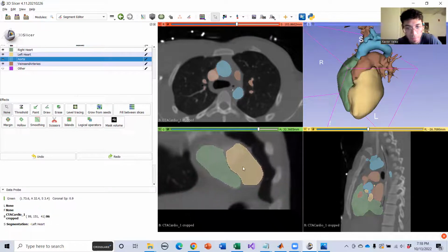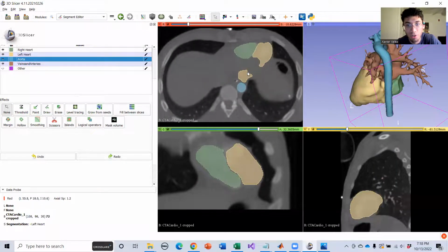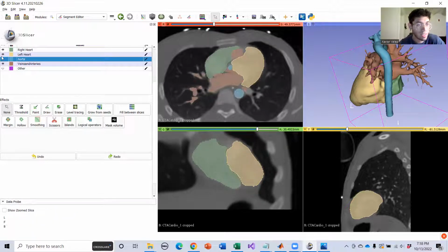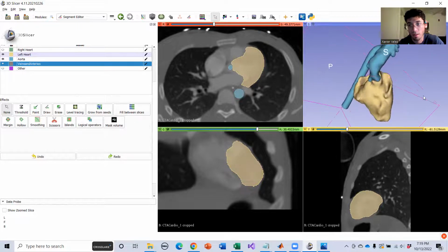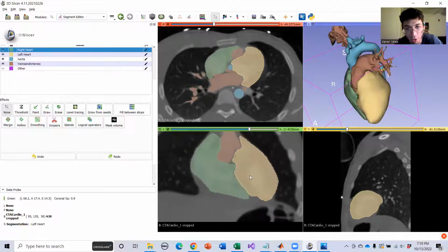And we're just going to want to individually edit pretty much every part of that, and make sure that it is what we want it to be, right? So these things can get in the way sometimes. So, I'd say if you want, you can remove some of the less useful parts, especially momentarily. I think it can be helpful sometimes just to actually end up seeing the gray.